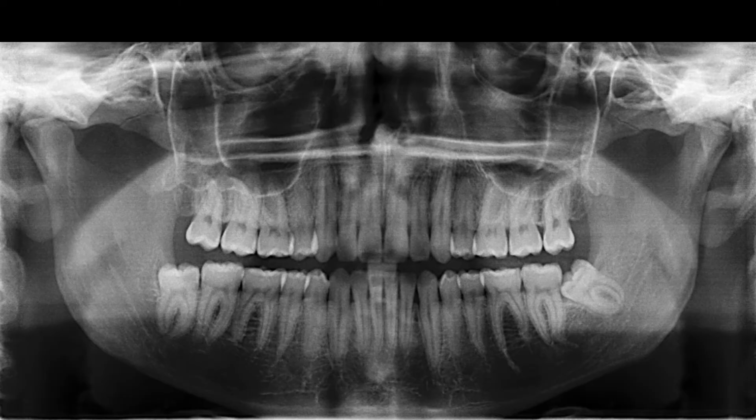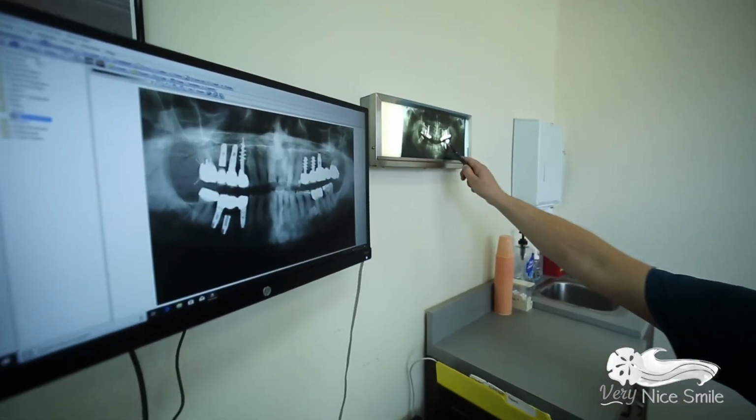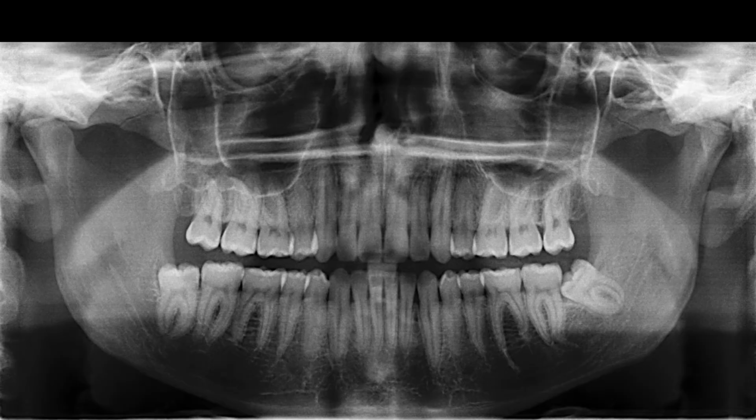Now, this is not a dental school type of video. This is just going to be for the average person when they go into their dentist's office and the dentist shows them their panoramic x-ray. This will just give you an idea so you kind of know what's going on in the x-ray when you look at it.